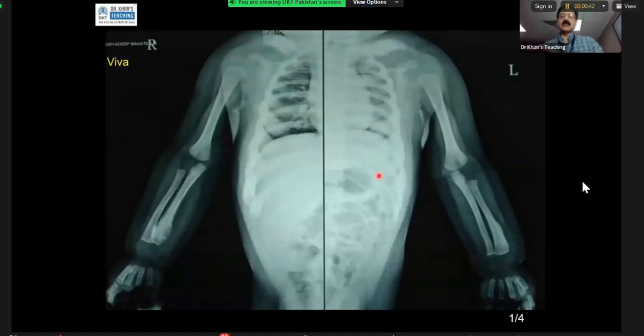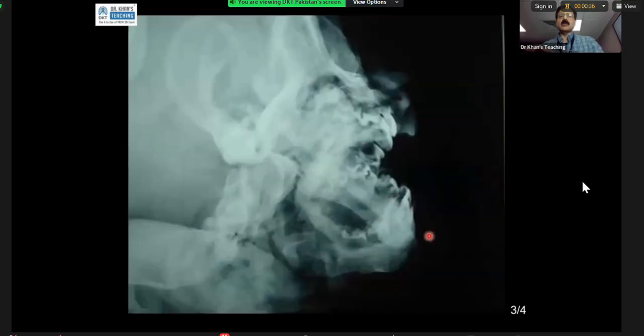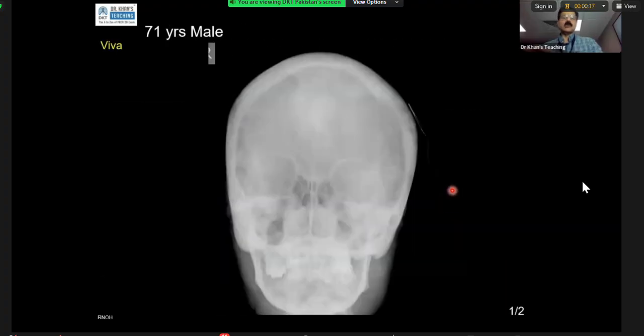You will tell the examiner, I want to see the mandible. If the examiner has the mandible, he will show you. Look at this case. Now, these are the teeth. Actually, where I'm pointing is the mandible, and everything here is new bone formation. So a very, very thick mandible. So you have to ask for it from the examiner.